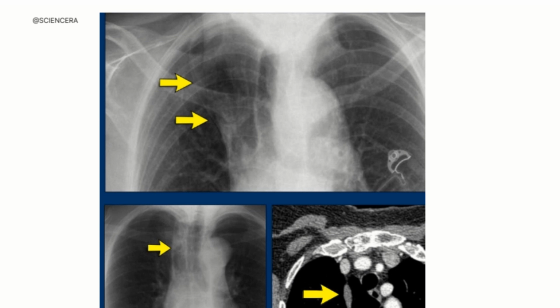So what does this mean? In simple terms, sometimes on the chest X-ray, the doctor sees something called your azygous lobe, and it is not a problem. It's just a normal variation that some people have. Normally, the azygous vein, a blood vessel in your chest, runs up the right side of your spine, but sometimes it's a bit off to the side, and when it moves, it can make a little split in the upper part of your lung.